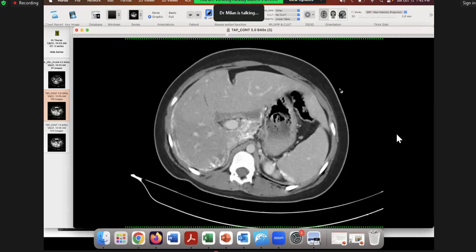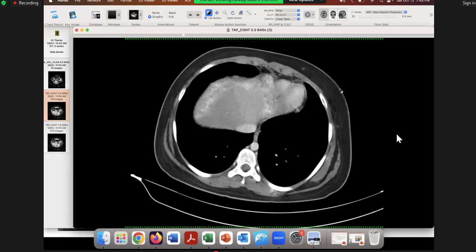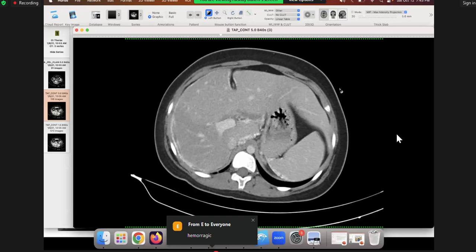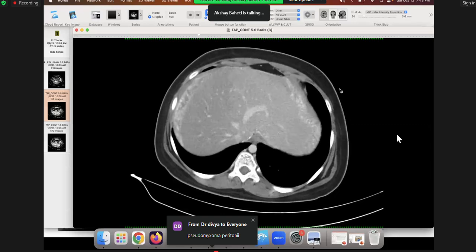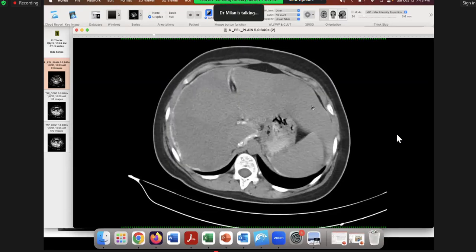So are there hypervascular deposits, sir? Okay, that's a good thought. It could be hypervascular deposits. What's the other thing it can be? When you see hyperenhancing content on a contrast enhanced scan, what are the things it could be? One is that they are hypervascular. What is the other thing? Calcifications, sir. Calcification, very good. And the third thing would be hemorrhage. These are too bright for hemorrhage, so probably in this case not hemorrhage. So what do we do to differentiate calcification from hypervascular deposits? Non-enhanced scans, sir. We have that. So now what do you think? So these are calcifications.